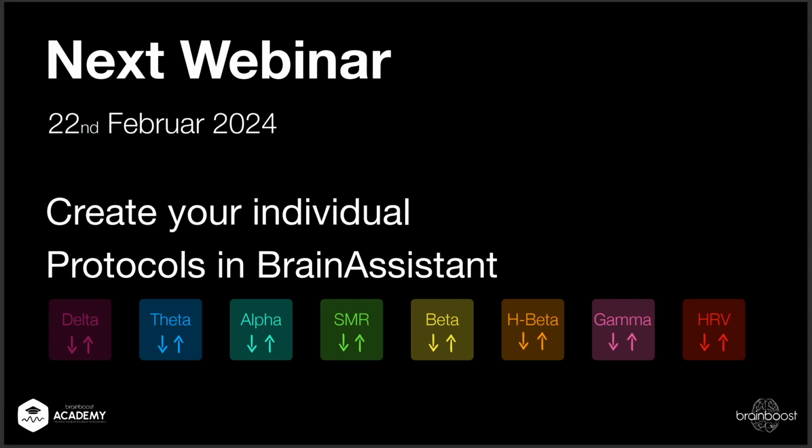I love that you can customize for different client needs, thinking of fluency assessments for kids with communication disorders. Yeah, thank you. This, for example, is one where you have the function to automatically open an app, so as to not put too much pressure on a person. So we say eyes open, eyes closed, a short, for example, search image, and then next step, skip, you can open an app and make it timed, so the app, like Focus Master or something, will close after 5 minutes and the flow continues, and then you have another measurement or something.